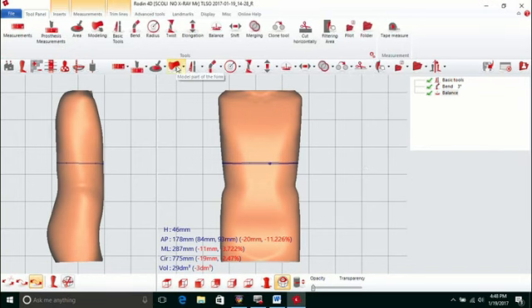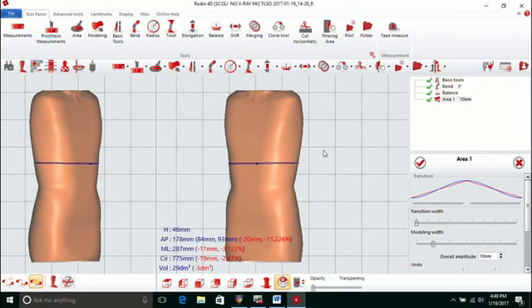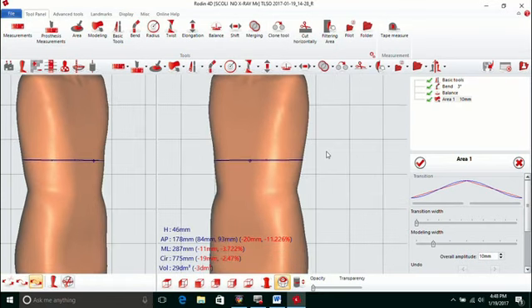Alright, so let's get into the modeling tool. This is for doing some reliefs. You can do reliefs, ribs, crests, and this is the good first learner tool, and eventually I like to see people get into the area tool. We'll cover that in a second.